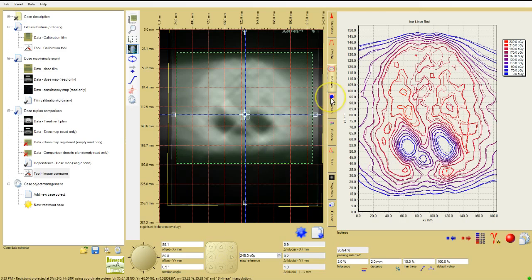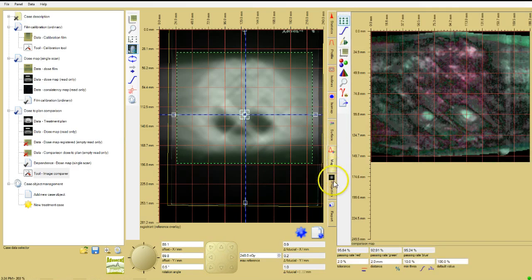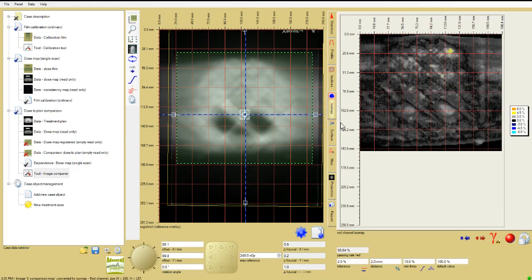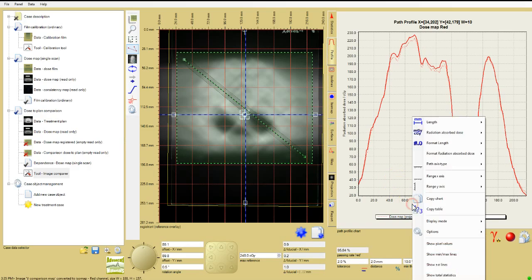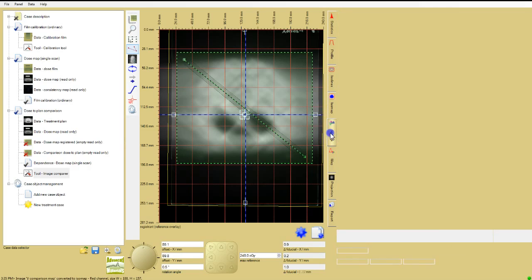Other features can be accessed using the tabs in the analysis window to display various charts and tables with analysis data, and any of these data can be added to a case report. Many of the display parameters, for example, axis ranges, line widths, display colors, etc., are automated or set by default. But if you right-click on any display near the axes of a chart or on a chart legend, the display settings can all be customized.